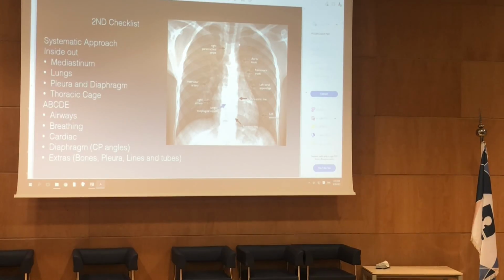The interface of the lung with the heart, or the mediastinum in general, forms a few stripes and lines, okay? So the interface of the lung with the trachea forms the right paratracheal stripe, and there is no left paratracheal stripe, or it's not something that we see or comment on. So this is a very thin line. If this thin line gets increased in thickness, like to more than 2 to 3 millimeters, then we have to suspect pathology: fluid, hemorrhage, lymphadenopathy, which is pathologically enlarged lymph nodes.